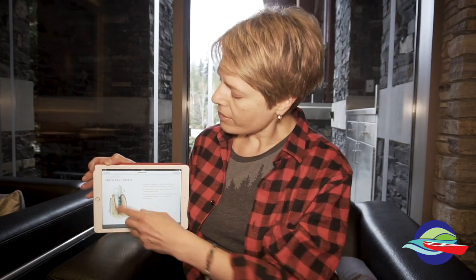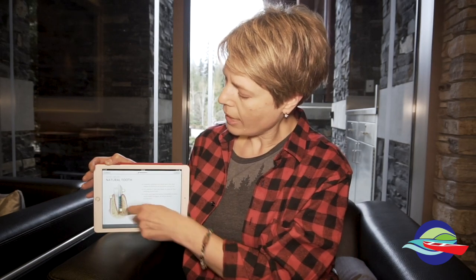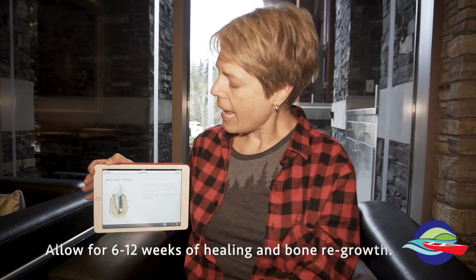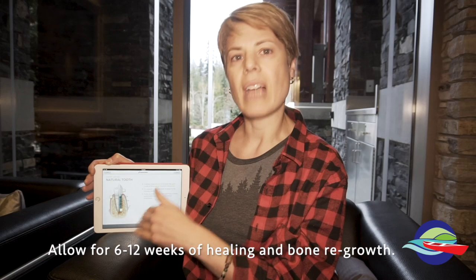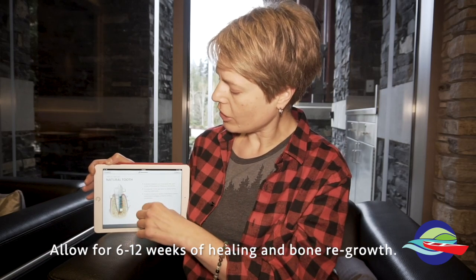implant. Once that tooth has been removed, we have a little empty ice cream cone, and what needs to happen is Mother Nature needs to fill that little ice cream cone in. And I explained to the patient that that takes approximately 6 to 12 weeks to happen. And it's very important in terms of the foundation to have that process occur so Dr. Fritz has enough bone to work with to place the dental implant.